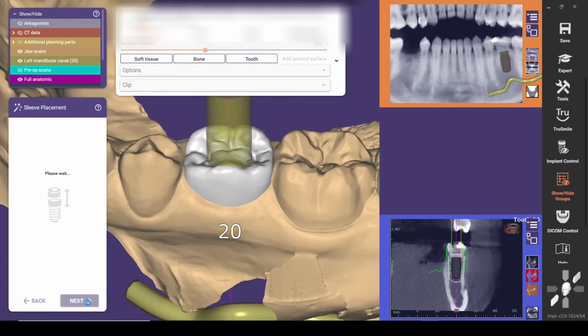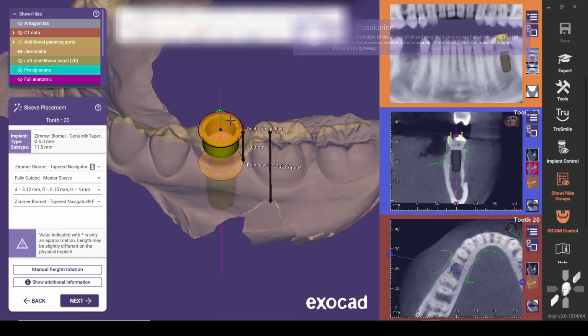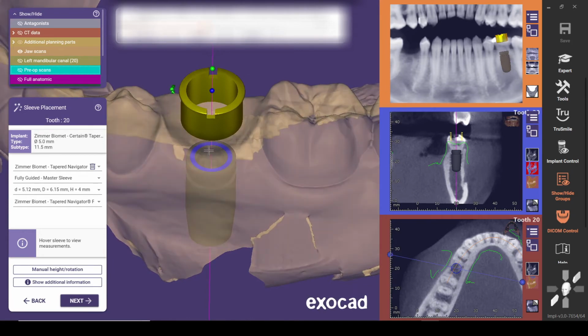At this point, we're going to set the sleeve placement. So these notches here, essentially, are for the one that places the sleeve. At this point, I never really change this. I used to, but just to visually show it, if we were to line this flat up right there with these notches on the sleeve, essentially that's how it's made.